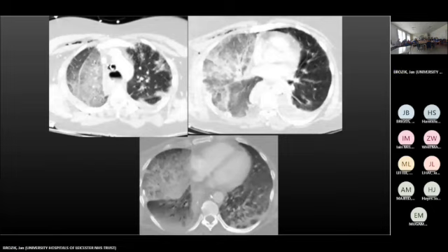Situs. Well, we're a bit above the diaphragm, so this is the aortic arch, heart. There's some air in the subcutaneous tissue. Yes, at the top. But surgical emphysema is quite common, and I can tell you this patient just had surgery, so we can still see some surgical emphysema. But this is not a reason for concern. Do you know what this line is?